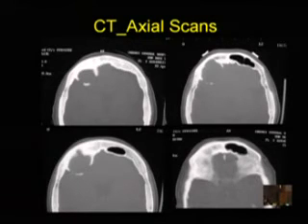If there's no communication between this bony-walled cyst and that frontal sinus, you've got to think about where it's coming from. Is it a supraorbital ethmoid, coming up behind the frontal sinus, which has formed a mucocele, or is it not related to the sinuses at all? Or could it be a type 4 Kuhn cell? No way.